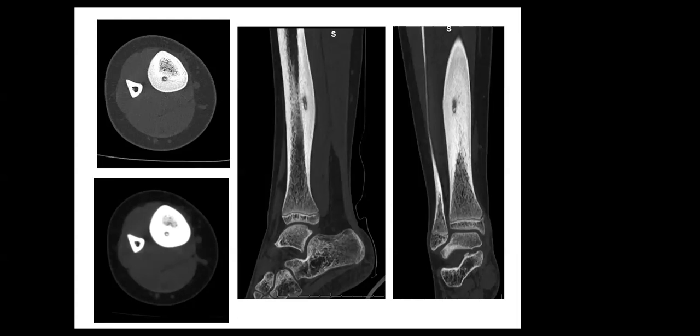By laser ablation, I think. Yeah, well, it could be laser or radio frequency. And both of them actually can be done in the radiology department. So you can say, well, the history is night pain responding to NSAIDs, and the CT shows features in keeping with osteoid osteoma. I would recommend referral for RF or laser ablation. So that's your recommendation for further management.